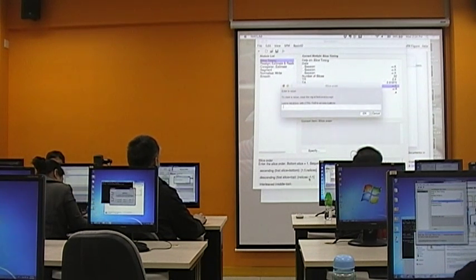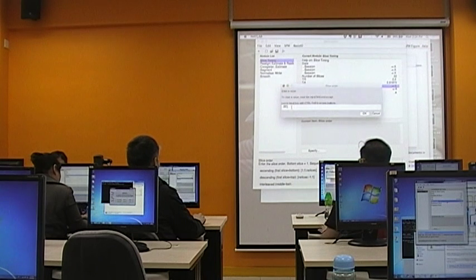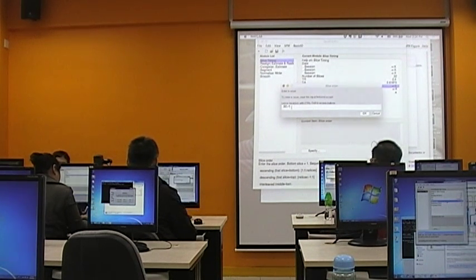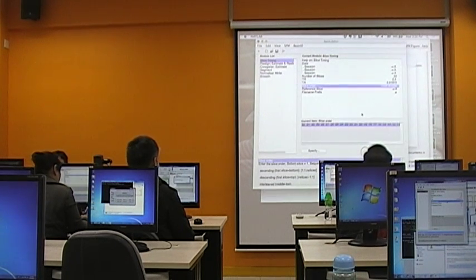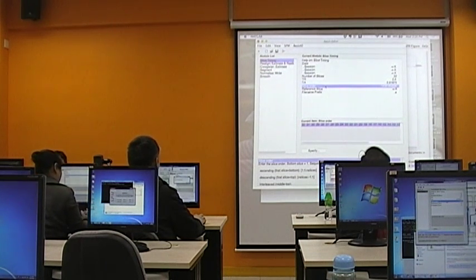This is a MATLAB expression. First begin with the last slice, 32, then colon minus 1 means that each time you jump by minus 1 step until 1. If you put in this value, you will see that you now have 32 numbers, from 32, 31, and so on back to 1. This is something you need to fill in.